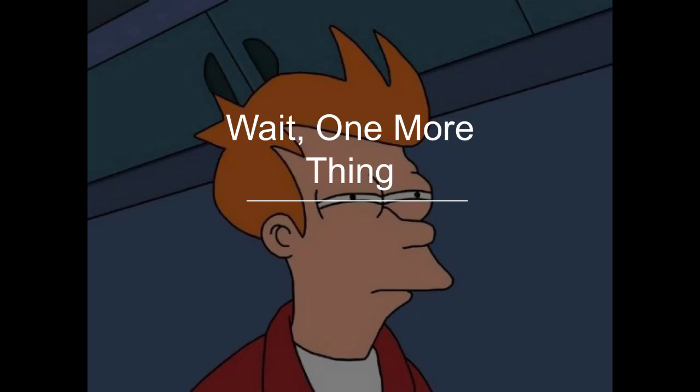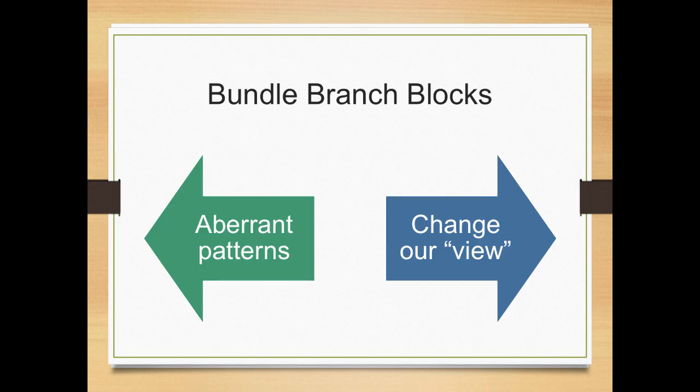You're annoyed with me already. I know it. I know there are a lot of criteria we just threw at you. But one more thing about ventricular hypertrophies before you completely shut down and sign off on me. I have to circle back and talk about bundle branch blocks again.